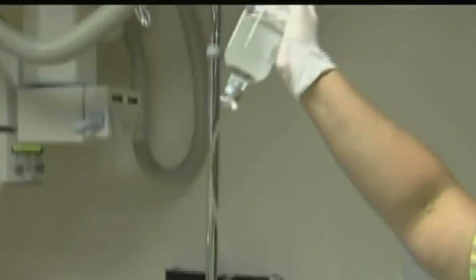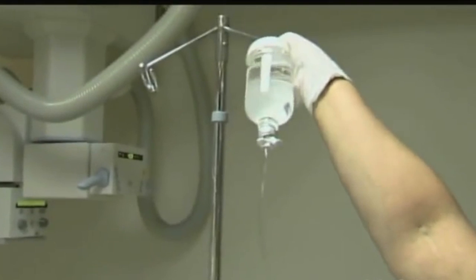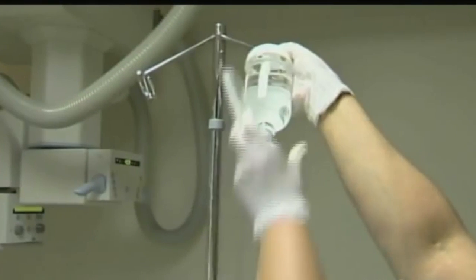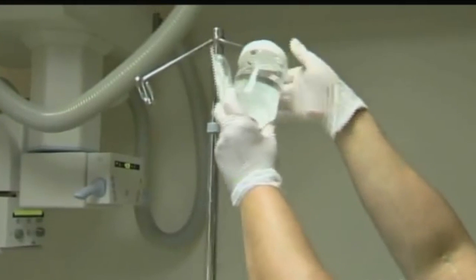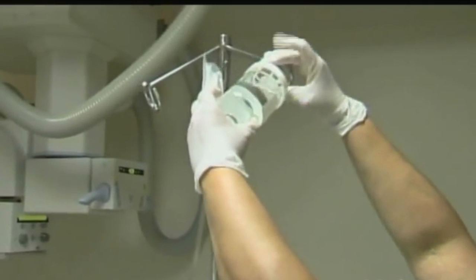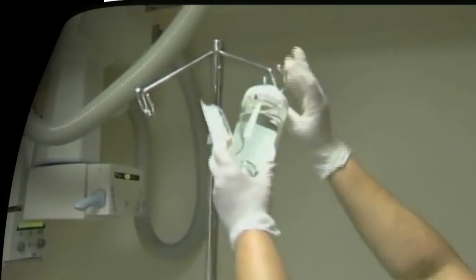Contrast medium should be instilled via the gravity drip method and not by hand injection. This prevents the introduction of contrast medium under pressure and is less likely to cause transmucosal contrast medium absorption and consequential contrast reactions. The height of the bottle controls the infusion pressure, so a height of about 3 feet above the table height is typically sufficient.